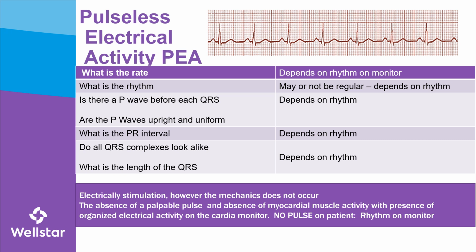So if you see a rhythm on the monitor, it does not mean that the patient has a pulse, so always check, especially in an ACLS situation.